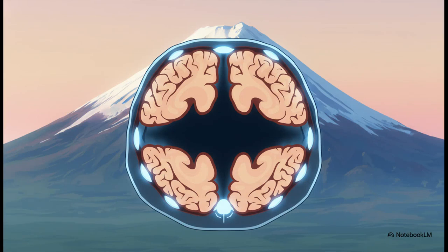And this pressure creates an absolutely classic image. The trapped air gathers at the front and squeezes the two frontal lobes, separating their tips. The shape it makes on a CT scan looks, and I'm not kidding, just like the peak of Mount Fuji in Japan. It's a striking, unforgettable sign of a true neurosurgical emergency.